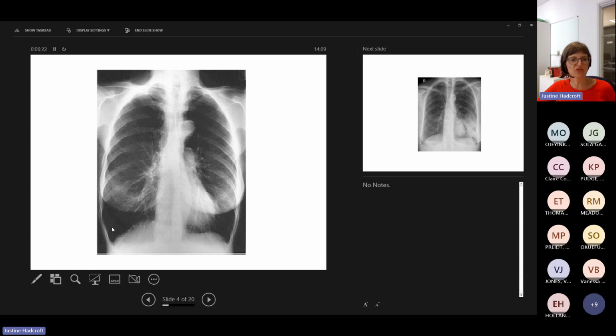And if you remember the previous chest X-ray, the lungs looked kind of greyish, but they look a lot blacker here, because there's more air in them, the more hyperinflated. Particularly down here it was really, really black, and you almost wonder if you might be missing lung markings, if it might be a pneumothorax, but it's not. It's just hyperinflated lungs. And the heart, instead of looking round and plump and sitting on the diaphragm, kind of floats above the diaphragm and is a little bit longer and thinner. So they're all markers of hyperinflation, and certainly we'll see that in people with COPD.